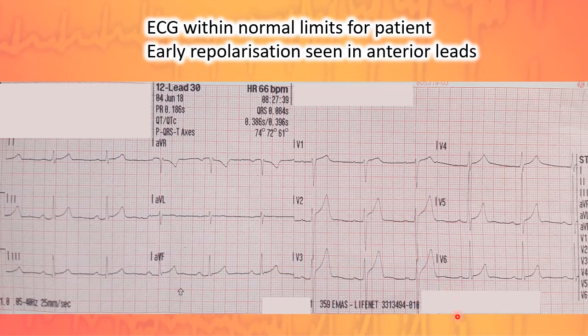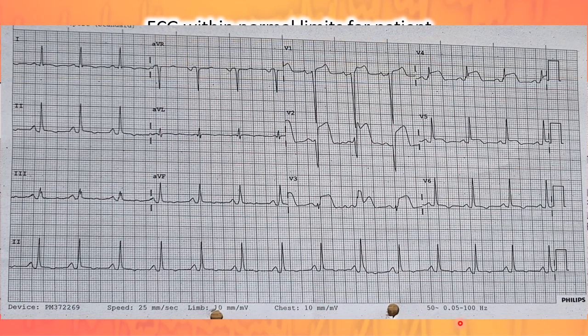If we contrast that with an ischemic ECG, we can see that the T waves are not clearly symmetrical. The ST elevation is convex rather than concave, and the J point is much harder to clearly define. The ECG has Q waves or marked loss of R wave. You can see a very, very small R wave, so they're not technically Q waves here, but you've got a lot of loss of R wave.